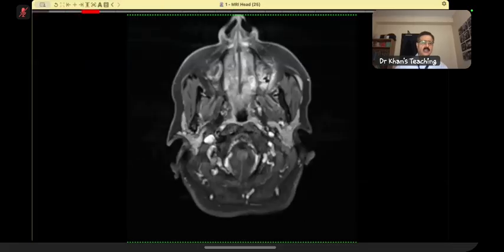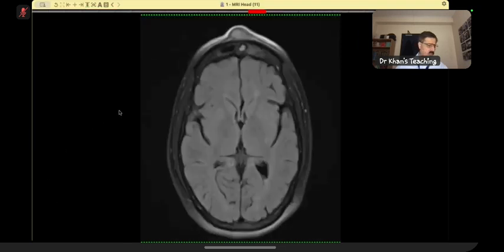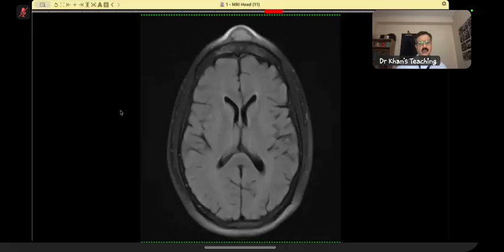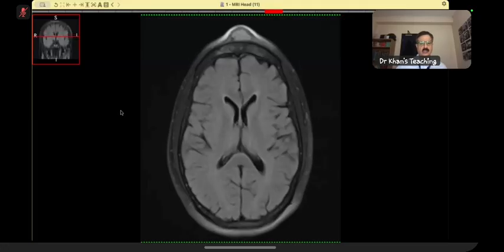That's fine. So this is basically an interesting case, and this is hot off the press. I reported it 3 days ago, actually. So the patient had banged the forehead, and there was a hematoma, and then presented back with this, a 68-year-old. Now, the candidate did well, except for 2 points, which I will point out as we go through it.